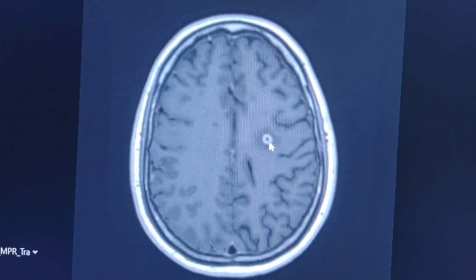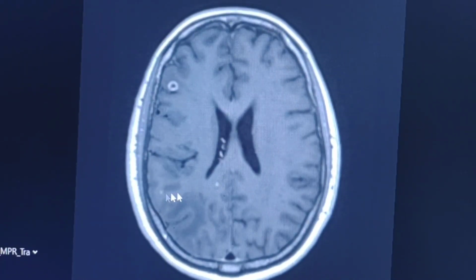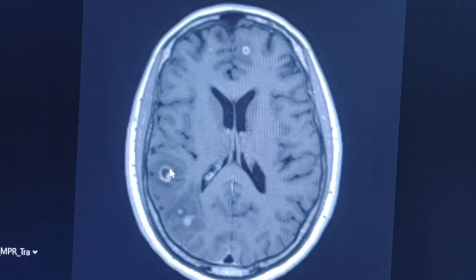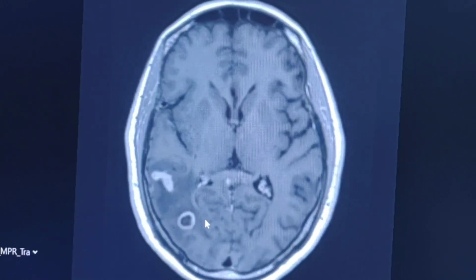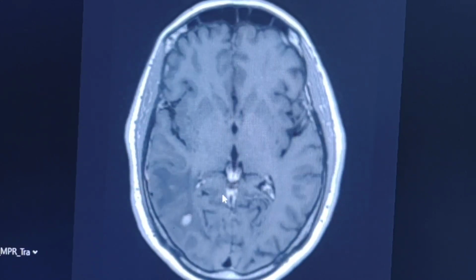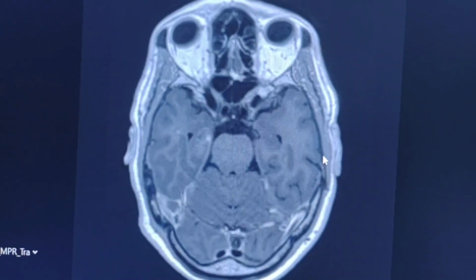Another one. Here is another one, a little larger, surrounded by edema. Multiple smaller. Here. Most of the lesions are well defined. They have smooth and enhanced peripheral rim, and they are surrounded by edema. This is a quite unusual case, that's why I would like to present it to you.